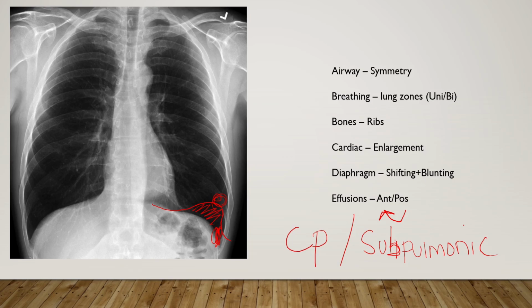Firstly, A to E. You already know A to E because you have watched a million videos on it. So I'm not going to bang on about it too much, but here is a normal lung. You can see the nice sharp CP angle. You can see 5 to 6 anterior ribs, which you should, and diaphragms are nice and humpy, okay, which you should see.